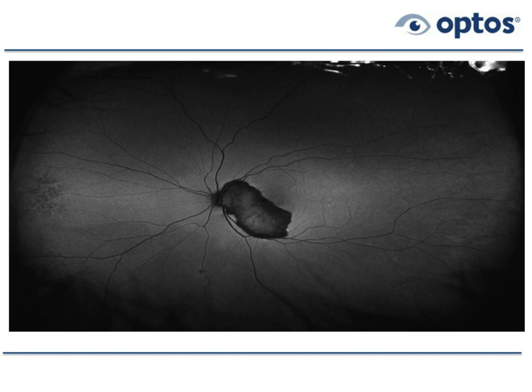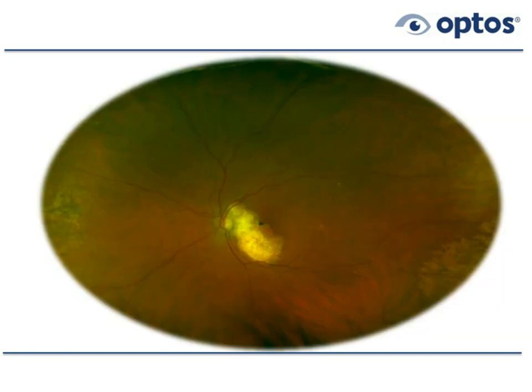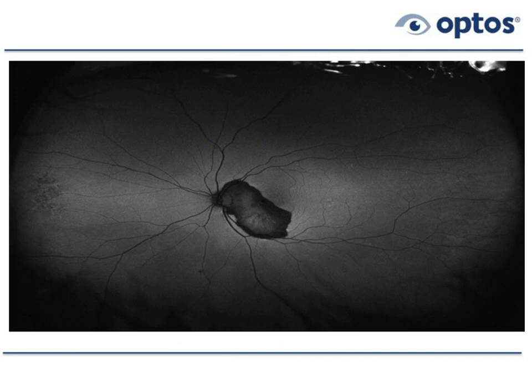One of the points to make here: this patient had peripheral, mid-peripheral, and far peripheral drusen and retinal pigment epithelial changes even before anything was going on in the macular area. Some patients have sort of pan-drusen, pan-retinal degeneration, and even though there wasn't much going on in the posterior pole of the left eye, when the patient came in, the patient actually had choroidal neovascularization, and the good news is it was treated in a timely fashion. So drusen and age-related mac degen can certainly occur in the macula where you expect it to occur, but don't be surprised at all if you see changes in the mid-periphery, as you can see some here, and in the far periphery, as you can see here, mostly nasally.